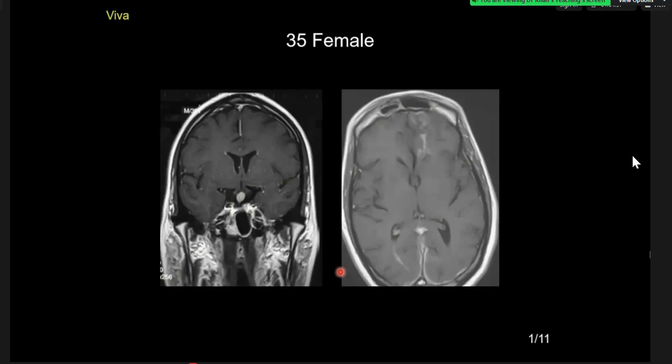Yes, there is patchy heterogeneous enhancement of the left frontal lobe. Okay, so you have picked up enhancement here. What's happening here and here? There is pachymeningeal enhancement posteriorly. Okay, so with this infundibular enhancement, dural enhancement, some parenchymal enhancement, which goes to the edge, what comes to your mind? Maybe sarcoidosis, maybe TB. Excellent. TB, sarcoidosis, also TB.